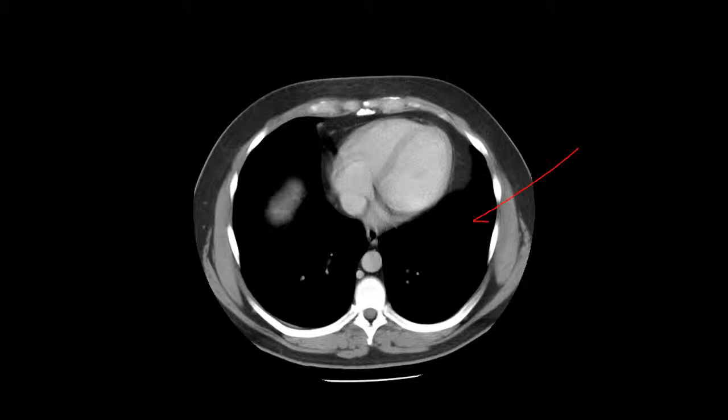If we look at a CT abdomen and pelvis, keep in mind that you're looking basically as if you were standing at the feet of the patient with them lying on their back. So this side is going to be the patient's left. This side will be the patient's right. Again, just like if you were standing at the foot of the table and looking up the patient. And then this is the top of the CT of the abdomen and pelvis.